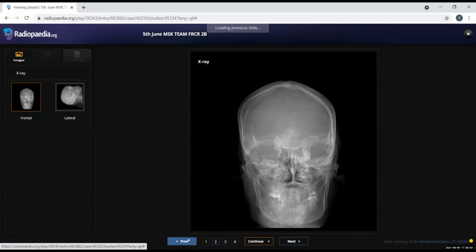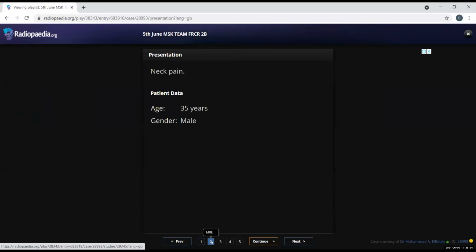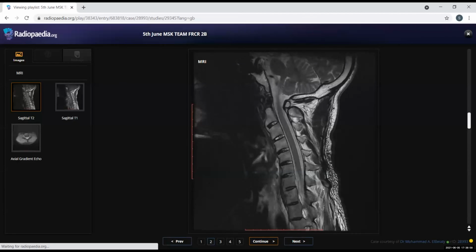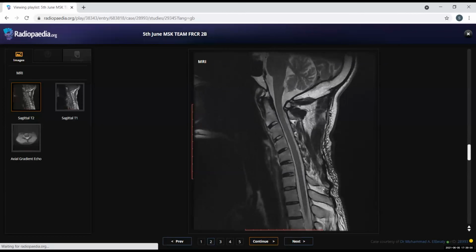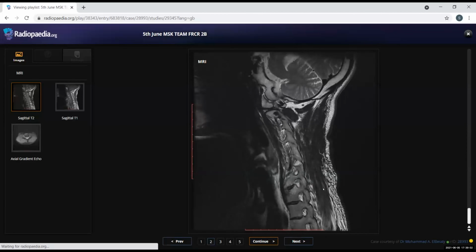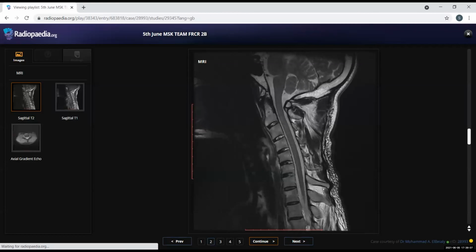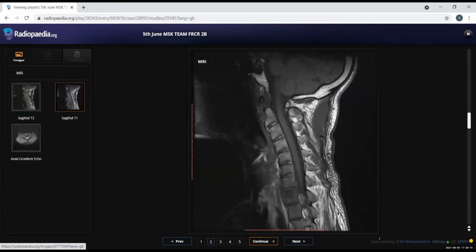Coming to this ankylosing spondylitis, very rightly picked up. I always get confused with this Romanus lesion, this shiny corner sign, and this Anderson lesion. Okay, so I just read the core before this. The Romanus lesion is actually the active lesion. Any active lesion would be hyperintense on T2. So this one that is hyper on T2 and hypo on T1 is the Romanus lesion.